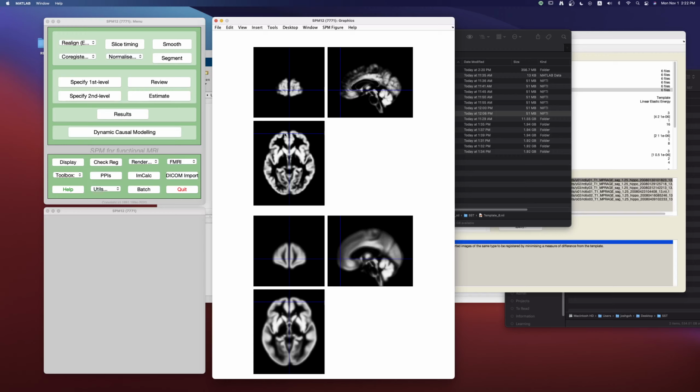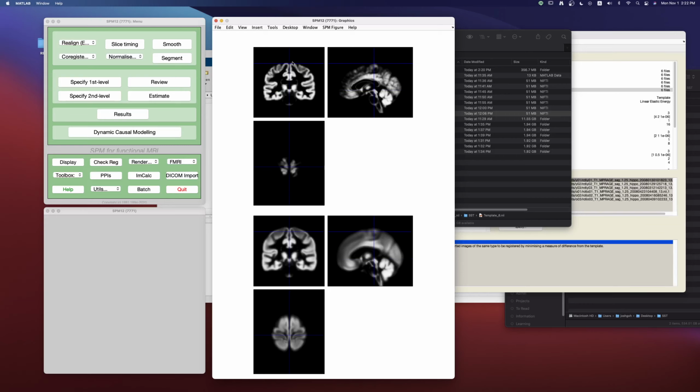You can see that there's not a whole lot out in front here, whereas there's a whole lot in the bottom, which is the MNI image. Most obviously, if you click the top, you can see clearly that there's quite a lot more brain here at the top, and here it's already at its end.